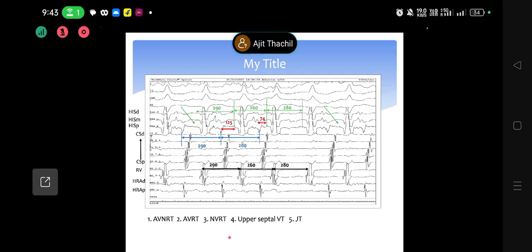Was it the H or was it the A? And then see, whether it was the H or the V that became early, did it make the next V early? If you have this entire combination of findings, you have defined the entire circuit.